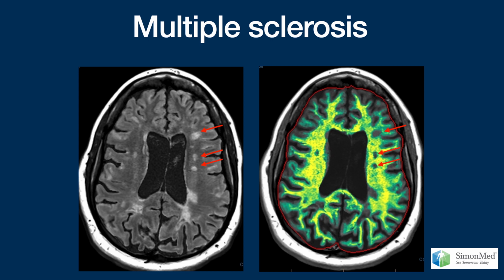There is dark gray showing within all lesions, representing the background T1 weighted image upon which the myelin is overlaid. Notably, there is little or no preservation of myelin in association with each FLAIR lesion. The underlying tissue is essentially devoid of myelin.